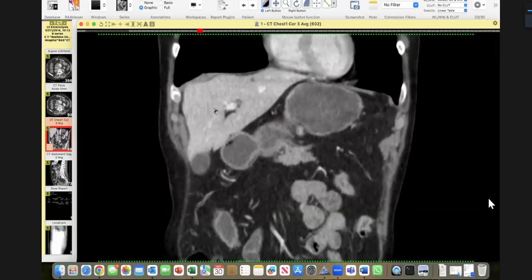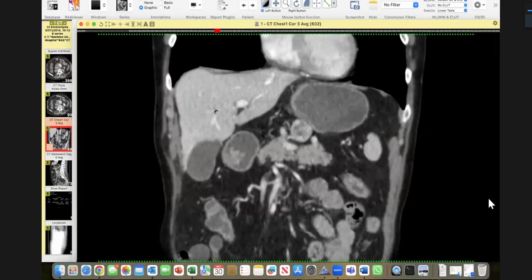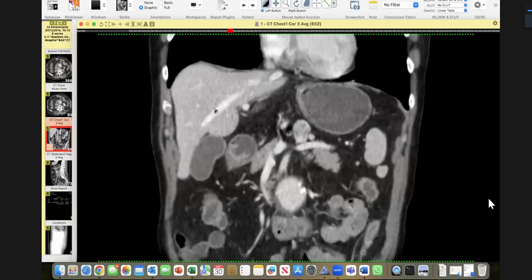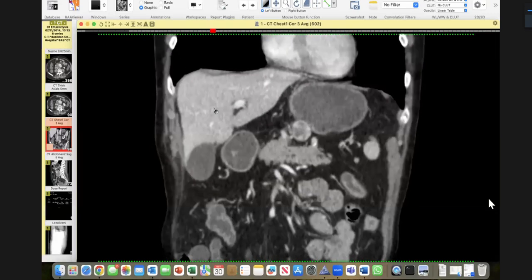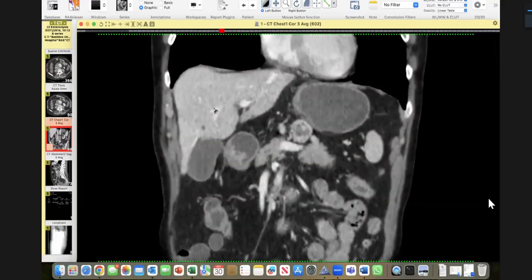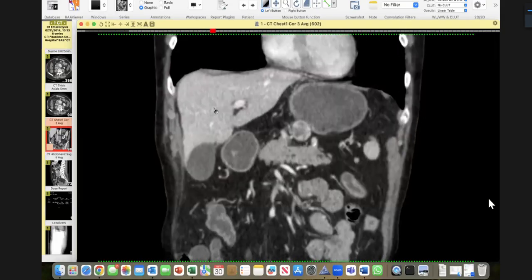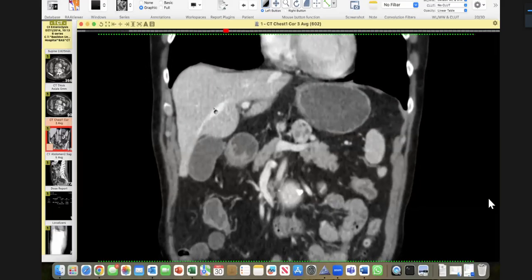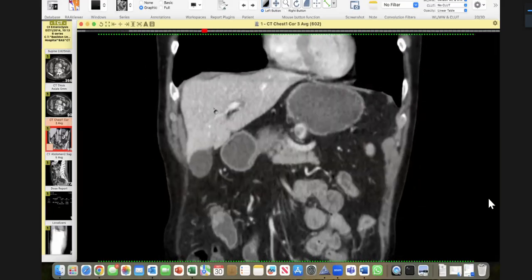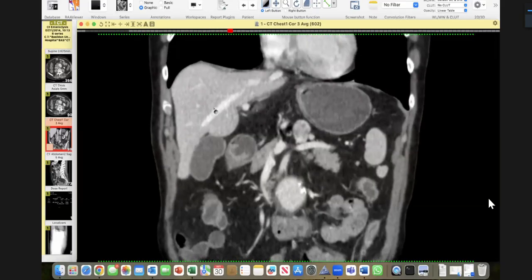So the same lesion, well defined, is re-noted. It is seen clearly separate from the pancreas with clear fat planes with the stomach as well. It does not appear to have a vascular origin. Though the images are jumping, the vessels appear to pass by the lesion discretely, without having any clear connection with any vessels.